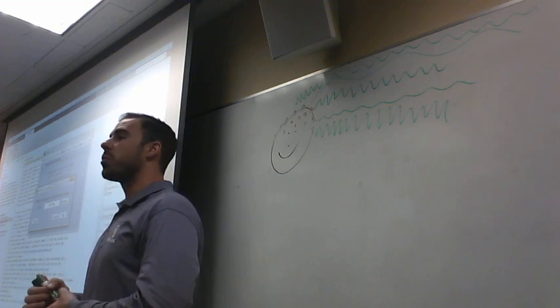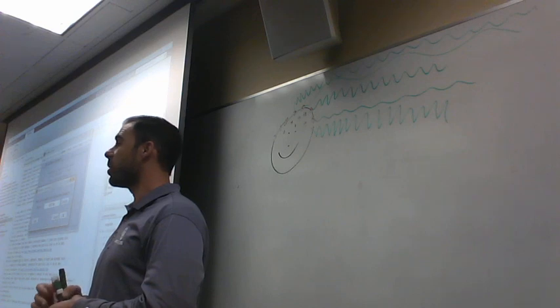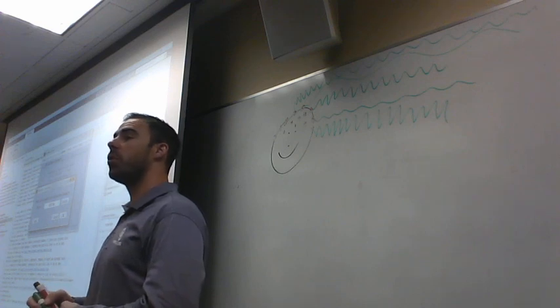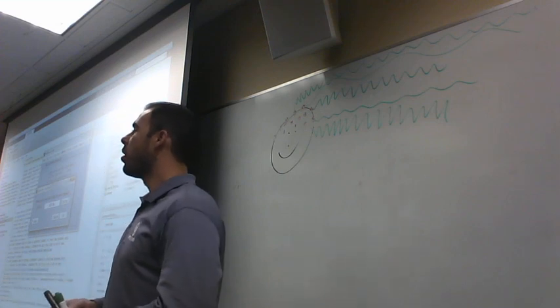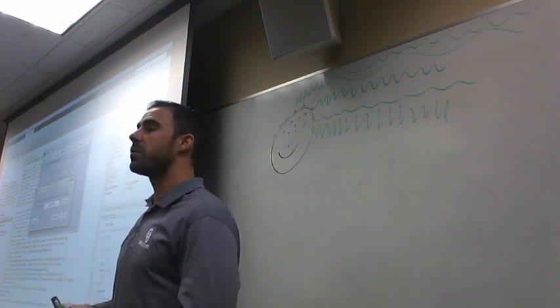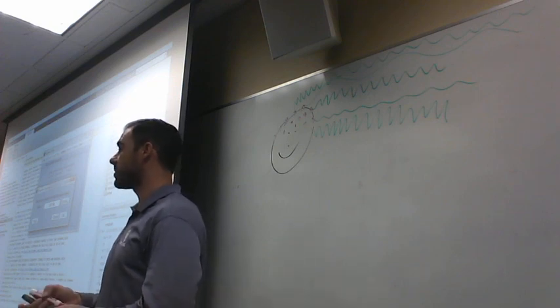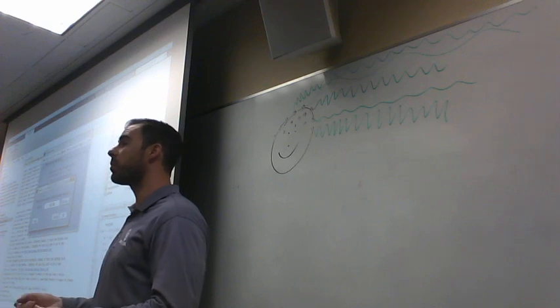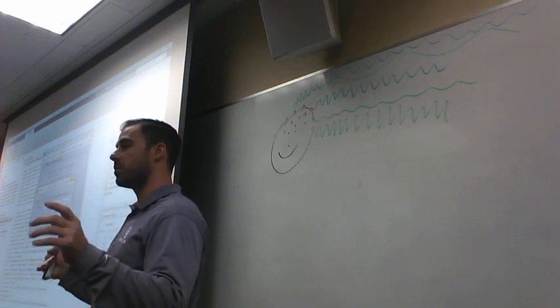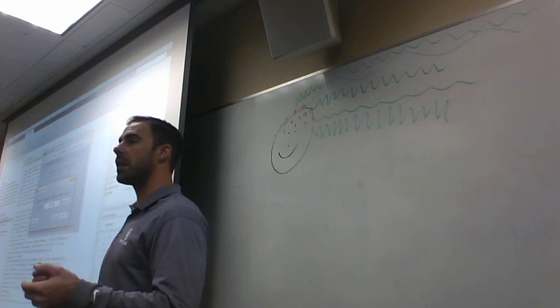We basically tell it, import the data, and the very first question it asks us is, how do you want us to import it? All these ones and zeros, these measurements you've taken of electricity, what do you want it to be in reference to? And we said we want it to be in reference to the average of the two mastoids. So we typed in the number for both of those channels, 33 and 34, and the computer then knows to average those two together as the reference.